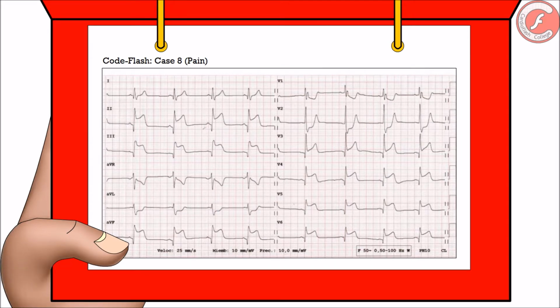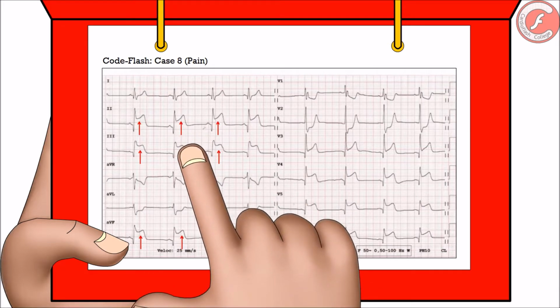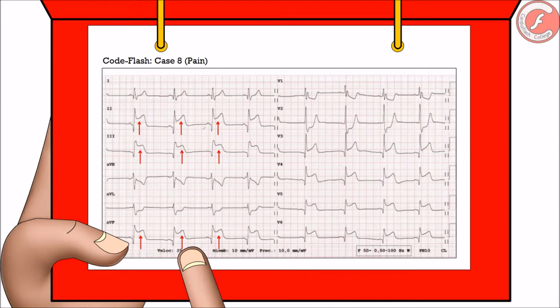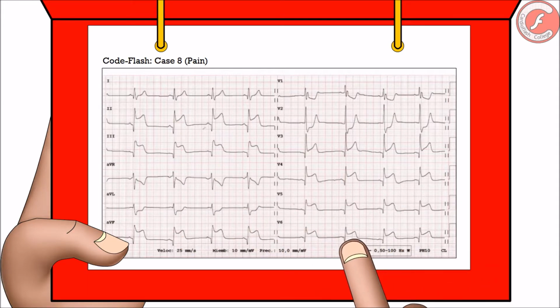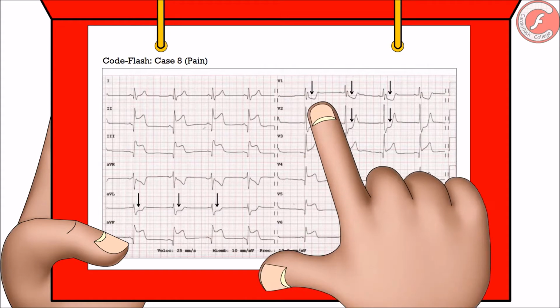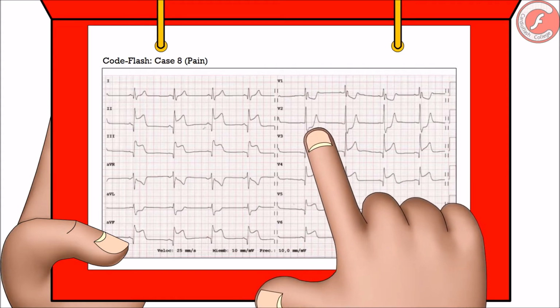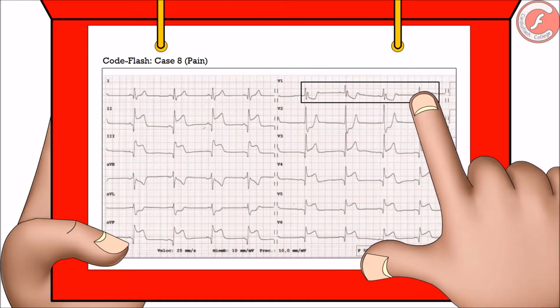That's it! In this electrocardiogram, we have an elevation of the ST on inferior leads, which are the leads 2, 3, and AVF. Moreover, we also have an elevation of the ST segment on V3 to V6 and a descent of the ST segment on AVL, V1, and V2. Also, an image of right bundle branch block must call our attention.